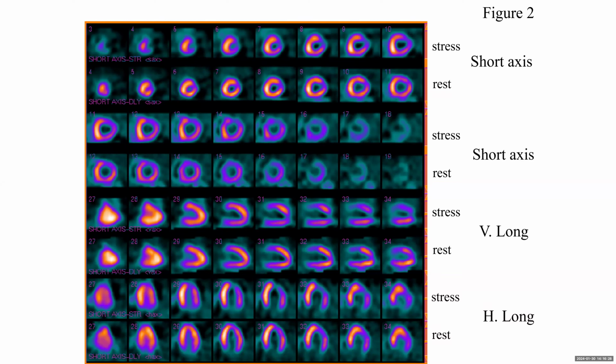ischemia. Number one. Number two, what else would you look for to assess the risk of a scan? So we said how large is the area. Number two, you mentioned multiple territories. So here we have a confirmed anterior wall or LAD, but also there could be a mid to distal inferior wall. So there are at least two territories: one large area, two territories. What else would you look at? Features of high risk scan.